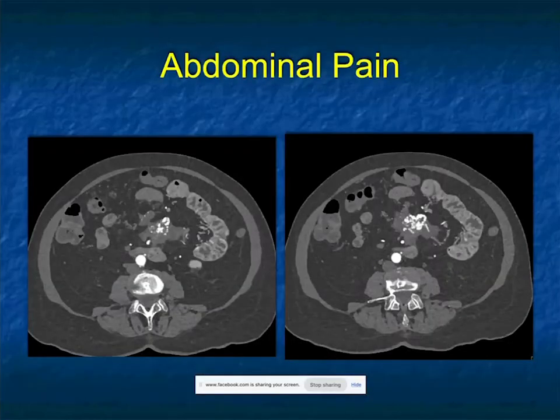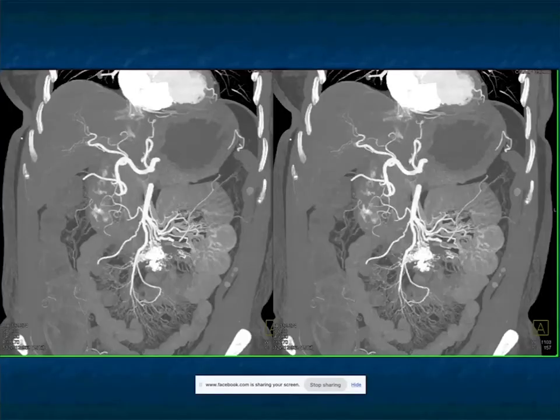Another case, abdominal pain, mass in the mesentery, dense calcifications, bowel is not obstructed. There's a slight desmoplastic reaction, looking at the branches off the SMA. The differential diagnosis here is sclerosing mesenteritis versus carcinoid tumor. You can get masses in the mesentery of nodes that calcify following treated lymphoma occasionally, but I didn't give you any history. Carcinoid and sclerosing mesenteritis can be difficult to distinguish.